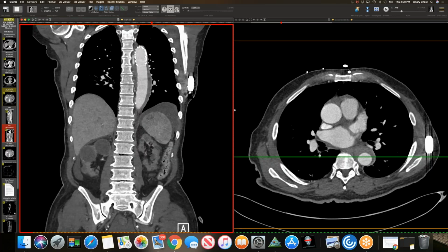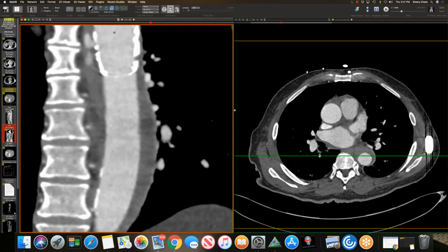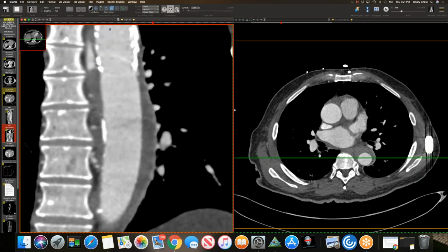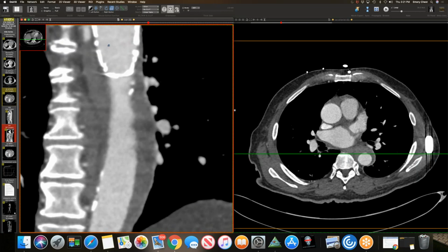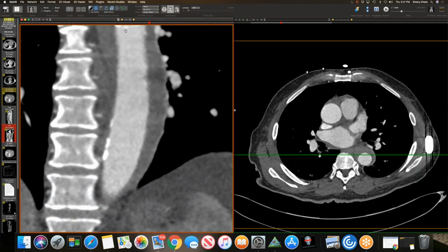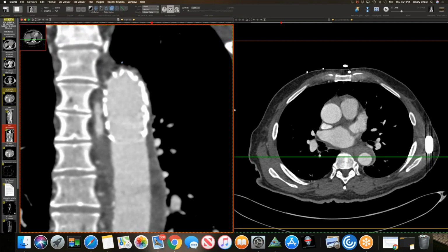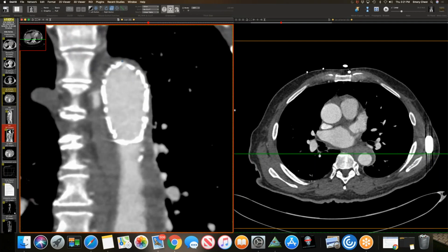So, okay, now just go slowly, because I think I could see an intercostal artery maybe coming out of the bottom of it. Right there, just pan down, bring it to the center if you can with the pan function. Yeah. The other way. Yep. Now scroll through that slowly until you see an intercostal artery, right? Yep. Yeah, exactly. I think so, yeah.